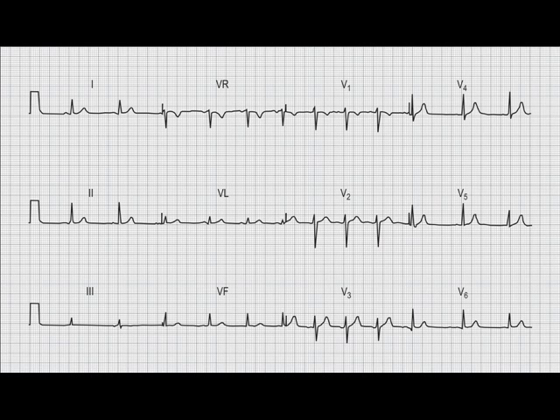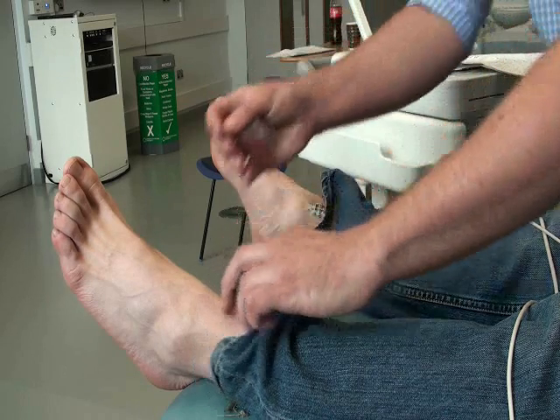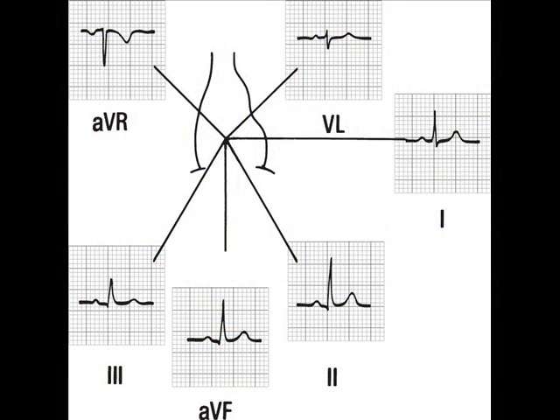Here's the normal 12-lead ECG, or EKG again, and you'll see to the left you have a variety of leads. These are the limb leads 1, 2, 3, and VR, VL and VF, commonly with the letter A before them. To the right are the chest leads, progressing from V1 to V6, sometimes C1 to C6, obviously standing for chest. You know when you place the limb leads on the patient that you place 4 of them, on the wrists or the arms and the legs. But in reality, the 12-lead ECG gives you 6 limb leads.